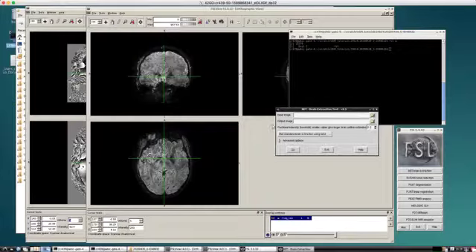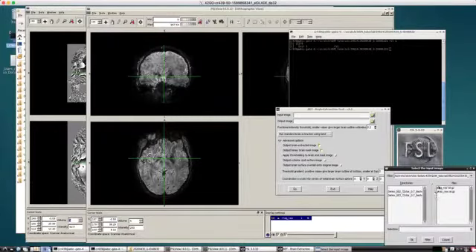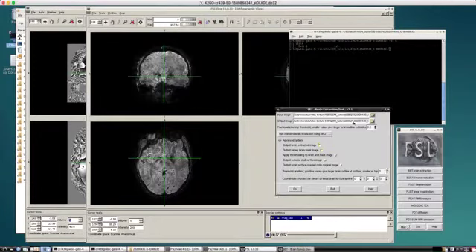I usually use a lower threshold for the intensity, and this is because when you calculate QSM maps, the actual filtering and whatnot will use a sort of eroded mask. So you won't be obtaining QSM values from within the whole mask, but from an eroded mask. So I suggest using quite a generous thresholding to include as much brain as you can. Okay, and I just upload the magnitude data.